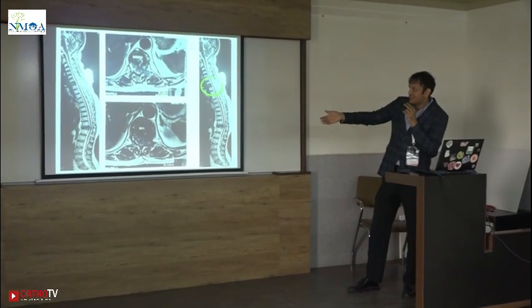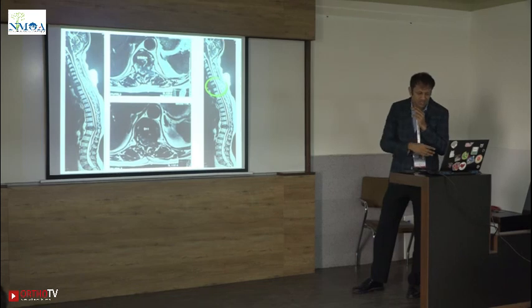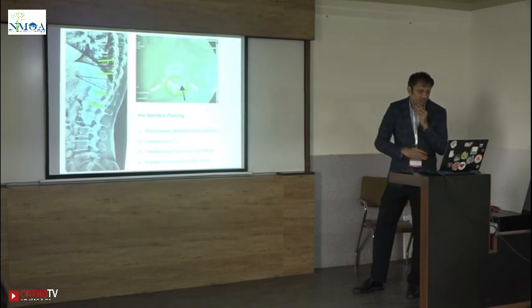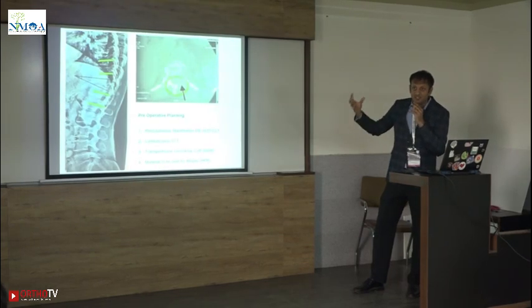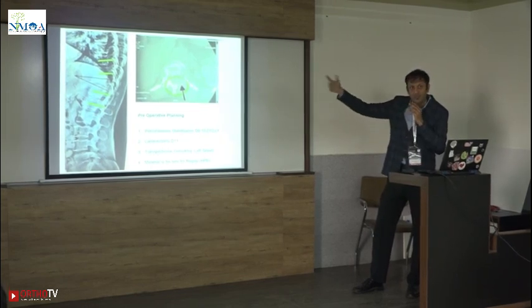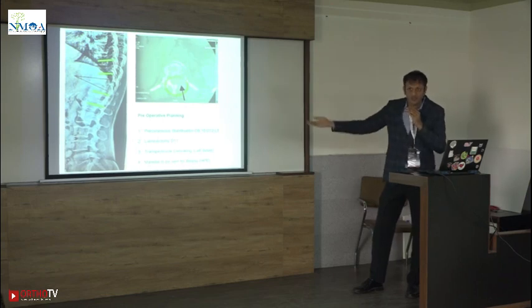This is another case. It was an RCC metastasis at the thoracolumbar junction. Whenever you have a pathological fracture, obviously after an MRI, you need a CT scan just to see from which side the tumor is behaving aggressively, from which side the tumor is encroaching. Not only does it help you, but it also helps you plan your surgery. If I am to plan this, I know there is a void in the lamina because there is extensive soft tissue involvement, so I'll be very careful by starting from the contralateral side before going onto the ipsilateral.